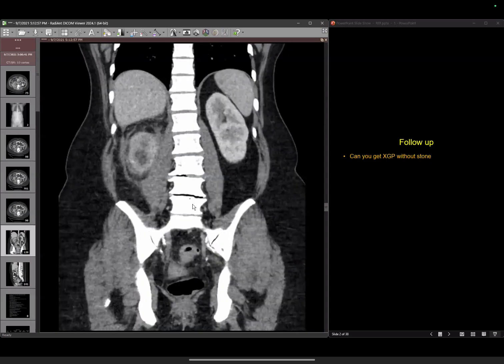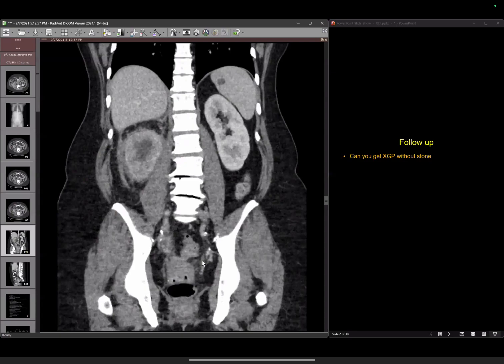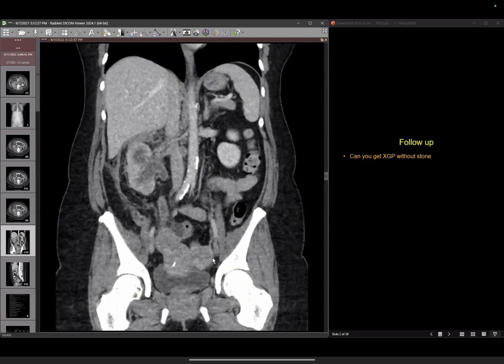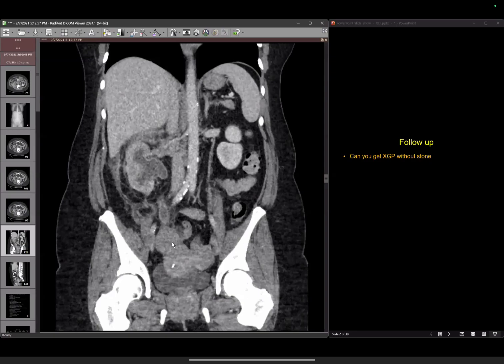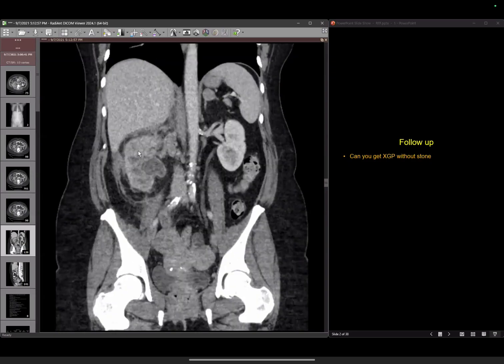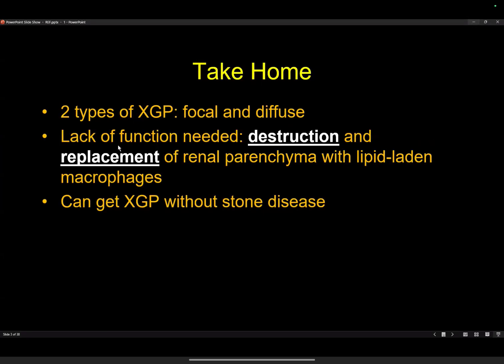And so the question was, is this primary ovarian, or is this something that is related to her breast cancer? She underwent surgery, and these were all metastatic lesions from breast. So she had bilateral ovarian mets, and the ovarian met on the right side had caused obstruction to this right kidney, and this was also xanthogranulomatous pyelonephritis. So that was the reason I'm showing you this case.